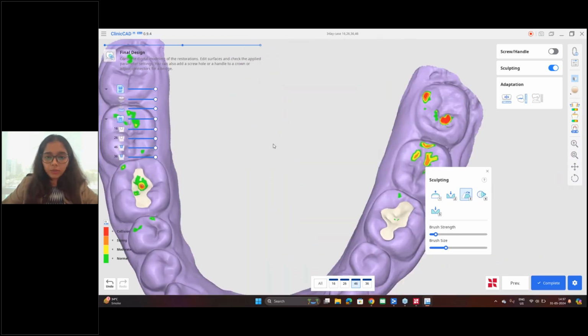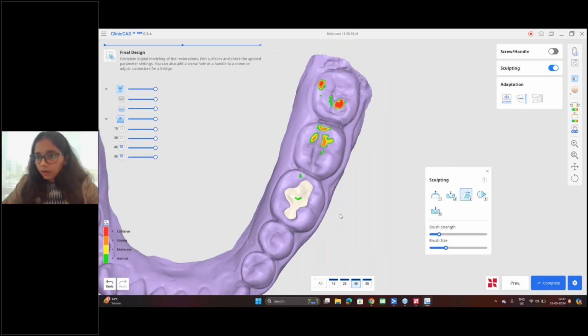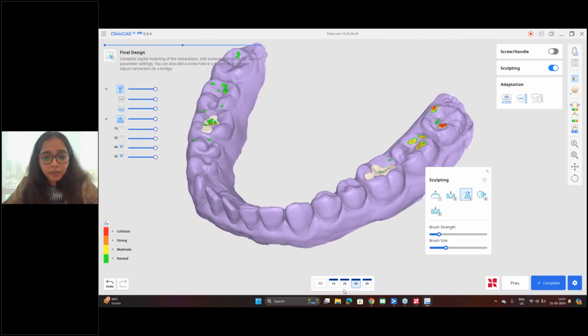Okay, so this is done for me. All right, the inlays are ready.